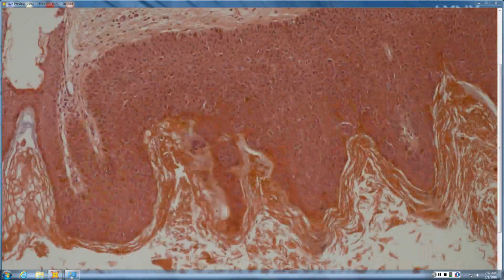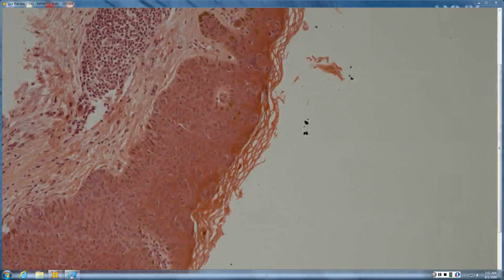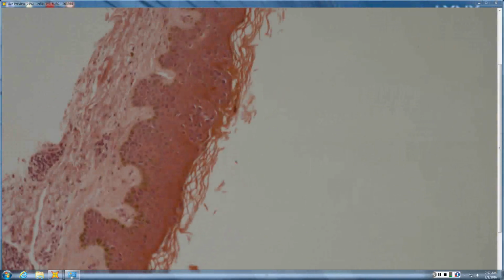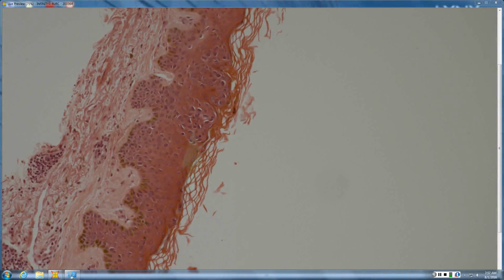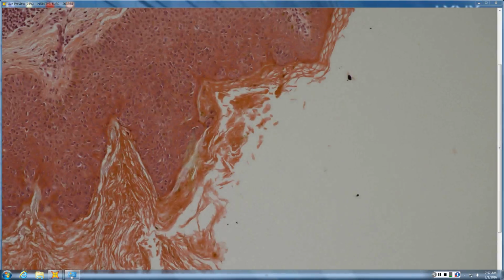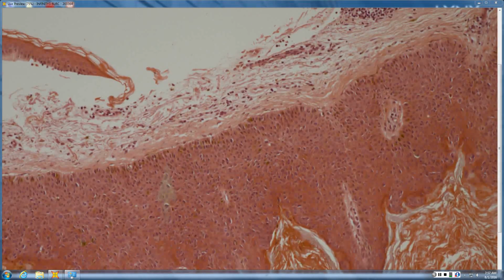This person has hundreds of wart-like lesions in the genitalia. So what's kind of where wart meets Bowen's? Like a Buschke-Lowenstein carcinoma? That's one HPV-driven variant. So HPV-driven, and so verrucous carcinoma. In fact, most genital squamous atypical lesions fall into that. But the one I was getting at was Bowenoid papulosis, where they look kind of like venereal warts, usually a little more pigmented. You can see the pigment within these cells. See all that melanin?